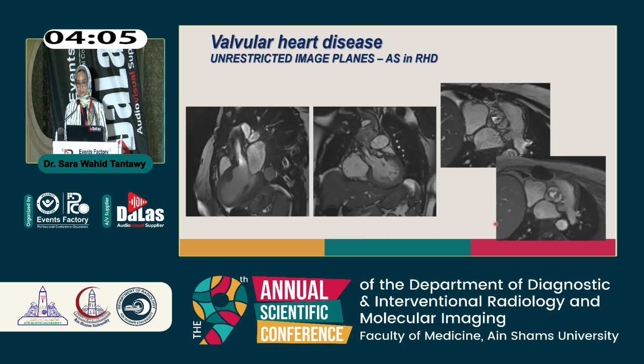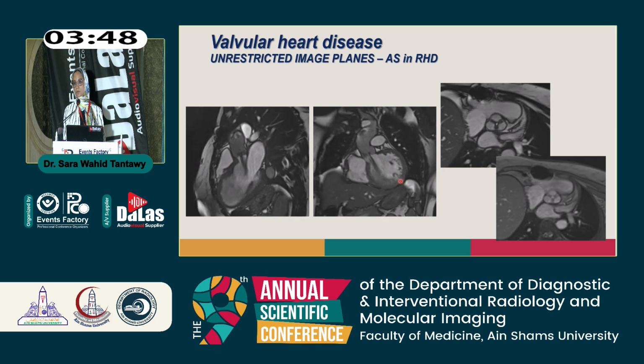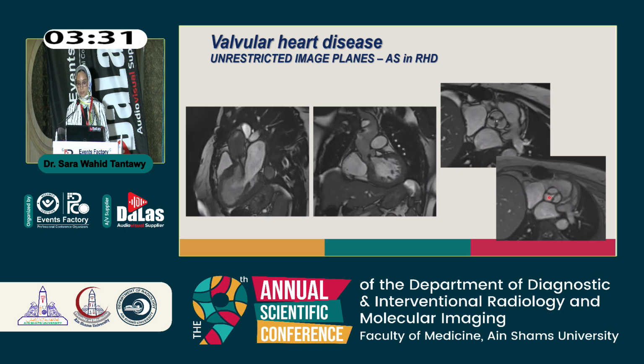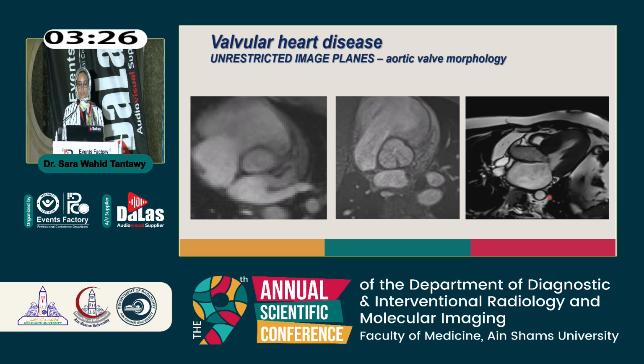And you can also focus not only on the mitral leaflet, you can take specific planes to visualize the aortic stenosis, which was also present in this case. We have the 3-chamber view, and we have the coronal LVOT view, which is dedicated to specifically acknowledge the aortic regurgitation or aortic stenosis that is present in the patient. And you can take axial images parallel to the aortic valve, which can show the restricted mobility of the aortic leaflets and malcoaptation, which leads to the aortic regurgitation, and again, do the direct planimetry of the aortic valve. It can also help you to assess the morphology of the aortic valve leaflets.